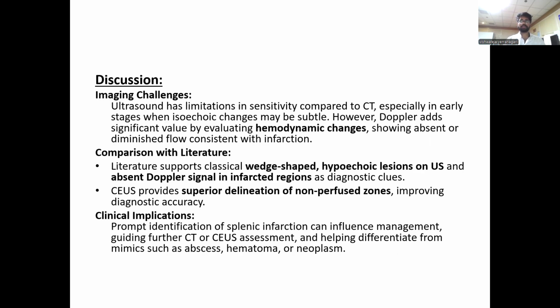Discussion, imaging challenges. Ultrasound has limitations in sensitivity compared to CT, especially in early stages when isoechoic changes may be subtle. However, Doppler adds significant value by evaluating the hemodynamic changes, showing absent or diminished flow consistent with infarction. Comparison with the literature: literature supports the classical wedge-shaped hypoechoic lesions on ultrasound and absent blood flow in the infarcted area as diagnostic clues. Contrast-enhanced ultrasound provides superior delineation of the non-perfused zones, improving diagnostic accuracy.